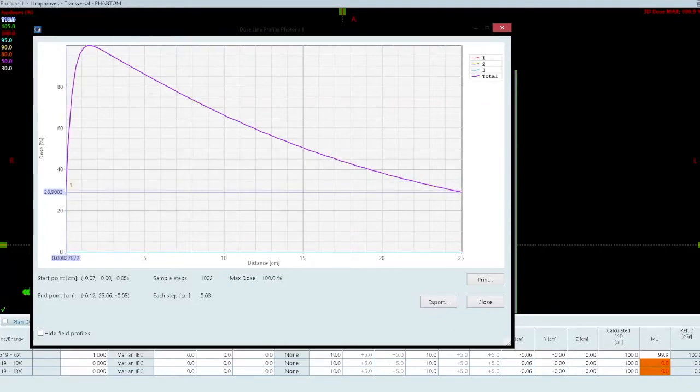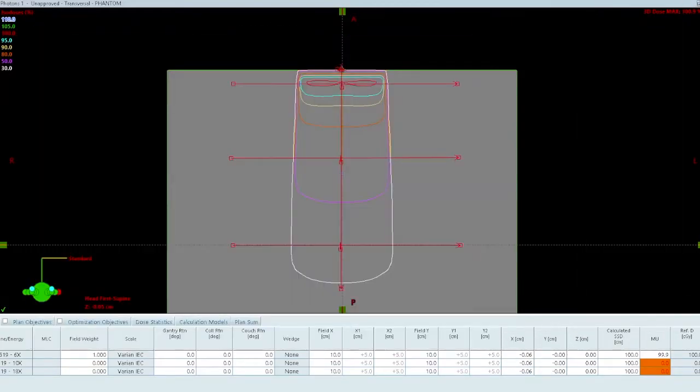My surface dose, you can see, is right around 30%, just shy of it. We have the buildup region, to Dmax. My Dmax point should be right at about 1.5, and then after Dmax I have this fall off region that trails outward. So at 25 centimeters deep in the patient, you can see I'm still getting 30% of the dose. So that's how we read a percent depth dose curve, which corresponds to the isodose line display, which has very discrete levels, and we can change these levels.